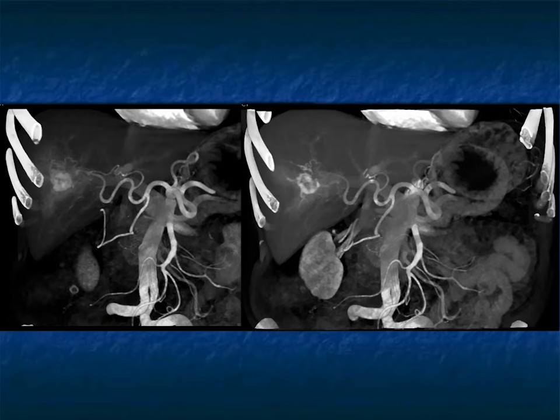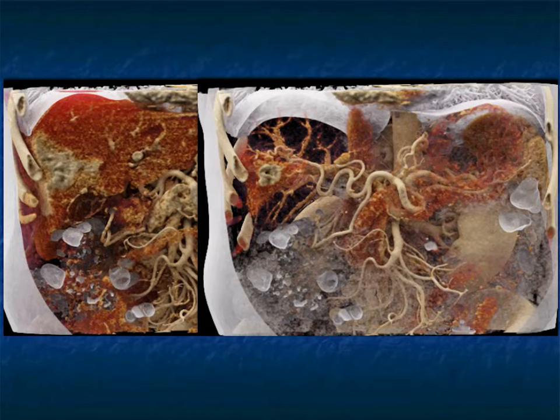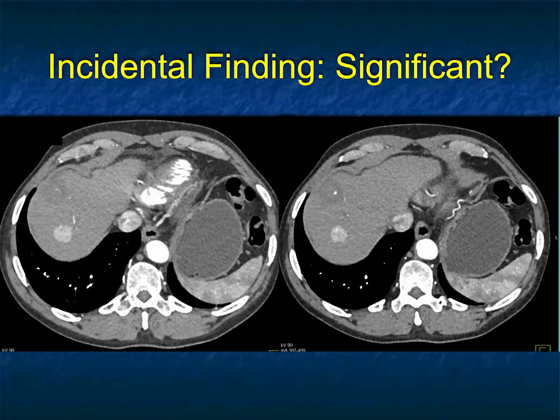their entirety. Here's the same lesion on the MIP imaging. We can see the hepatic artery feeding the lesion. You can see it here as well on the cinematic rendering, where the perfusion changes around the hemangioma are well seen. So we typically like to think that if you see perfusion changes around a lesion, you got to be thinking about malignancy. But the truth is, most vascular lesions, whether it's hemangioma or whether it's a hepatoma, can have perfusion changes. Other benign lesions and things like duct dilatation and things like infection can also have perfusion changes.